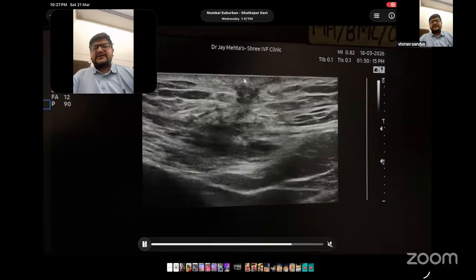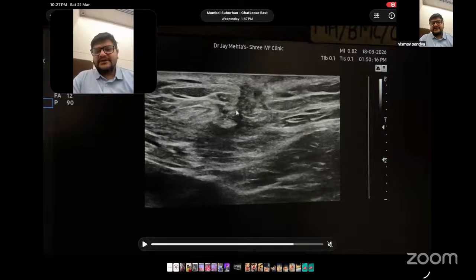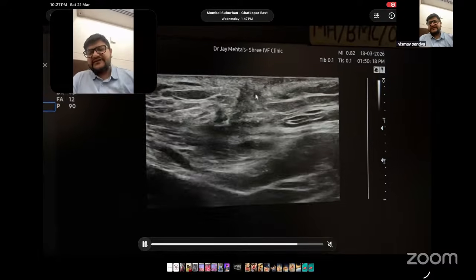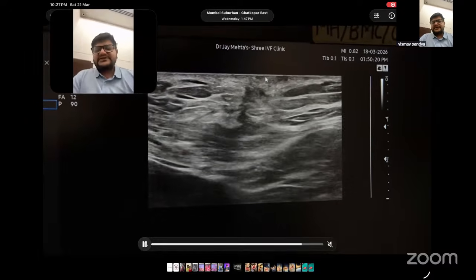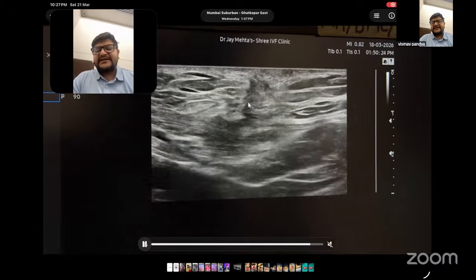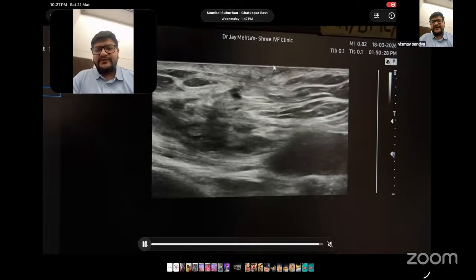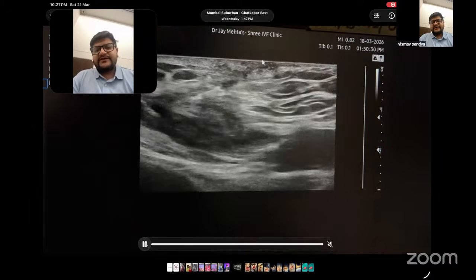When the preperitoneal distance of the nodule is less than 1 centimeter, there is a very high chance during the excision, because we maintain around a 1 centimeter margin from the nodule circumferentially, that the peritoneal layer might open. As a surgeon or as a radiologist, you should inform the surgeon that there is a very high chance you may enter the peritoneum in such cases.